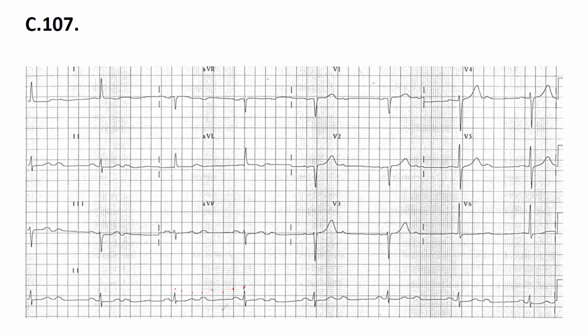The RR interval is inconsistent? As in the length is consistent, but the height isn't. It doesn't matter the height right now. We see the rhythmicity. You said it's rhythmic, good.